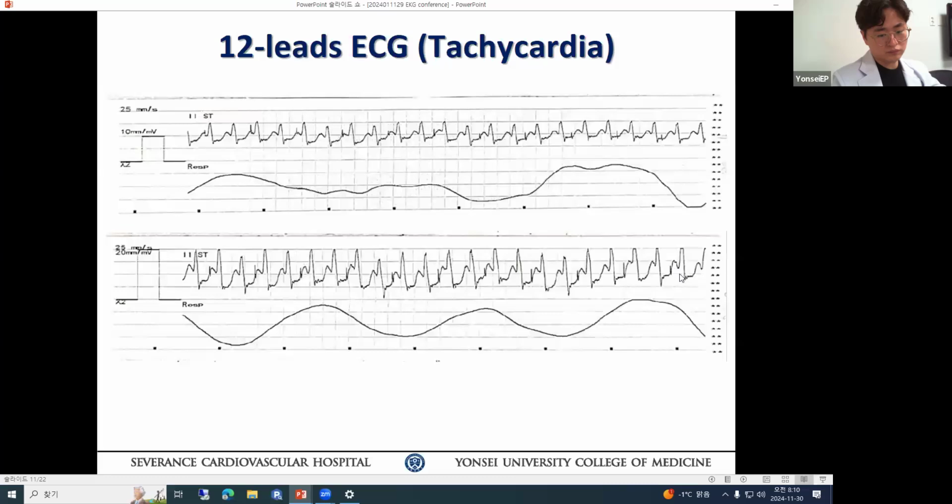There's no reason for the P wave to be deformed as well. In other words, QRS and P are absolutely refractory to the atrioventricular node. Therefore, there's no real reason to deform that P wave, unless there's a secondary activity going on. So it is probably 2 to 1 conduction going on. That would favor flutter 2 to 1. That's what I would favor. Pacemaker sensing is 2 to 1? Yeah, it's possible. Yes, right. Yeah, it's a large part of the tracing.